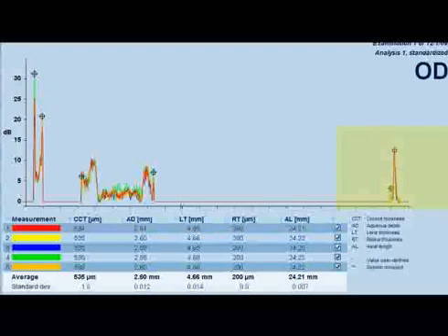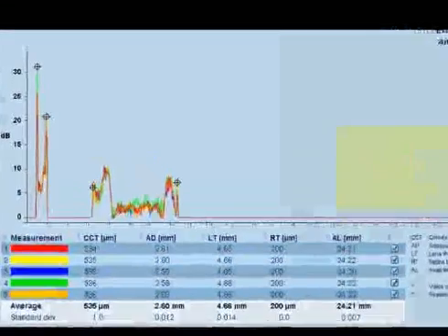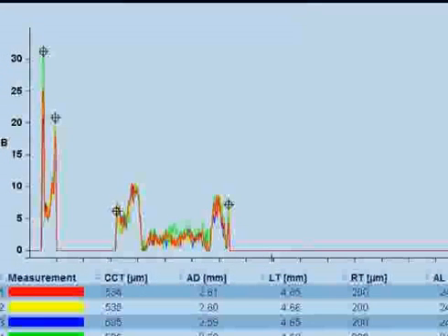It is important to note, however, that the current US version of the software does not allow for retinal thickness analysis pending FDA review. The crosshairs mark the point of intersection between the average value of the measurement readings along the optical axis. The software adjusts this cursor automatically.